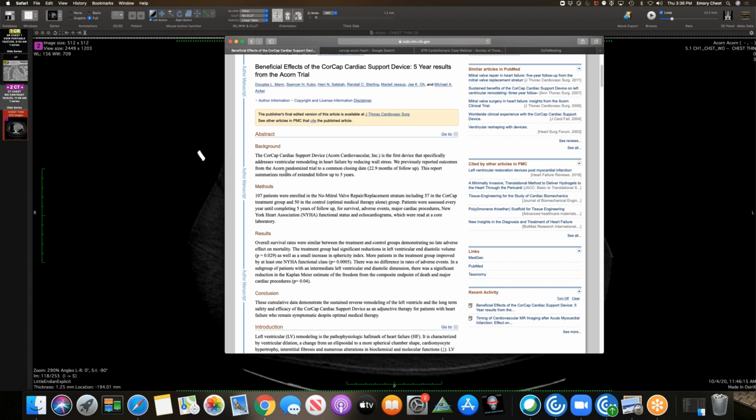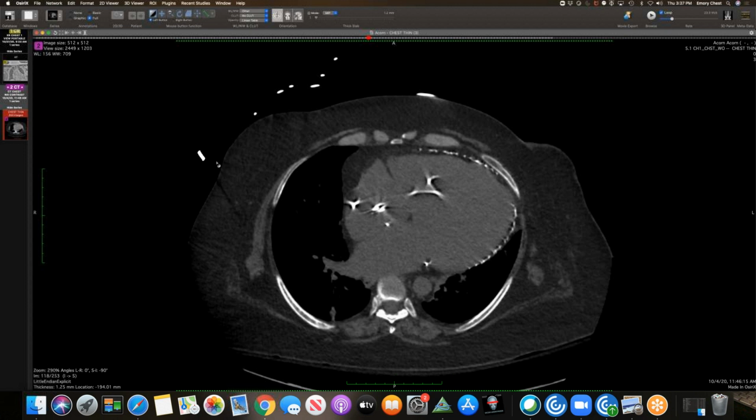Well, presumably, if we believe that all of the nodules are the same as this one, which they almost certainly are, then yeah, this is a granulomatous reaction from silicone. It's really interesting that it's more upper lung predominant. I don't have a good explanation for that, because you would think it would be hematogenous and therefore be more in the lower lobes, but it's not. So this was a new one for me.